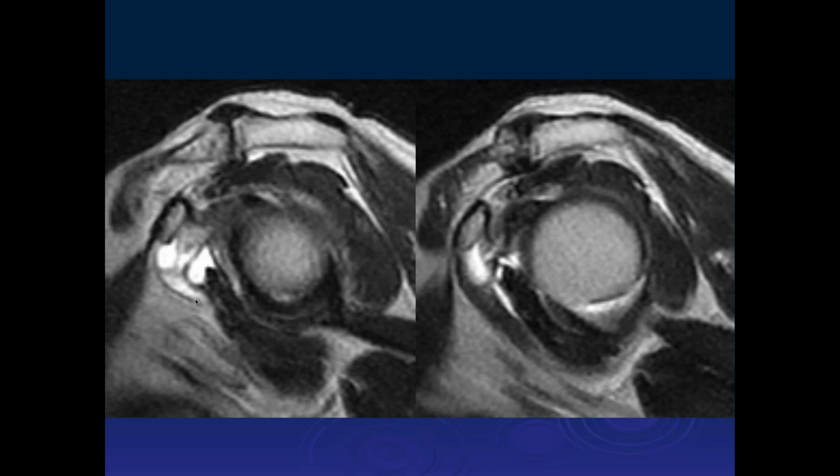And here you can see where the subcoracoid bursa is separate from the subscapularis bursa. This is the joint capsule. This is joint fluid here. This is fluid outside the joint, which is in the subcoracoid bursa, which comes down in front of the subscapularis muscle. So this is indicative that you're probably dealing with a tear, or either that or pathology of the subacromial subdeltoid bursa, and this is just fluid in the joint space.